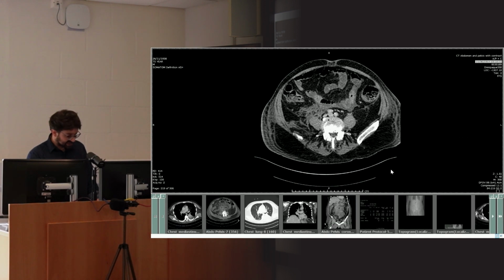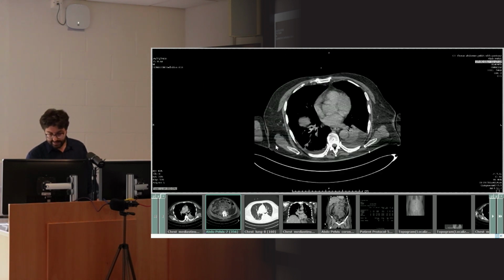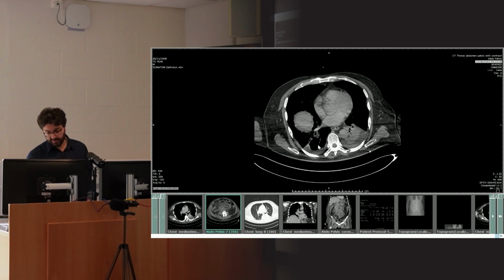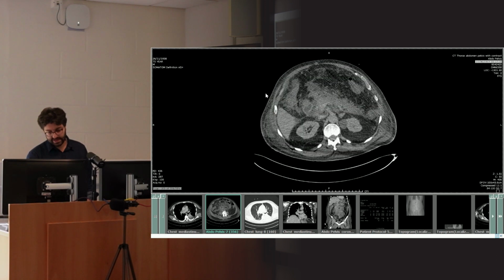These patients often have loads of scans. So another 4 days later, they have another CT scan. Let's see what that looks like. So again, fluid effusions, although the one on the right is getting a bit better. Still got, oh God, loads of fat stranding.